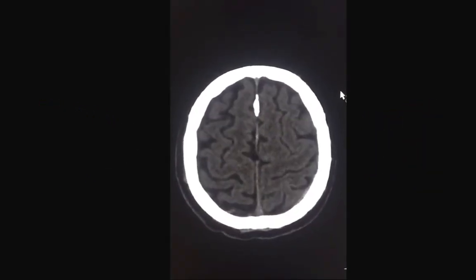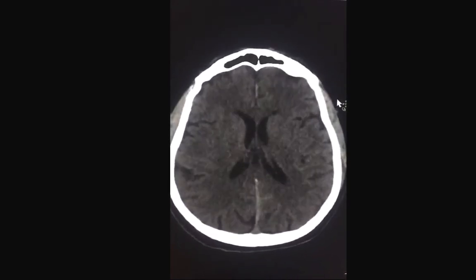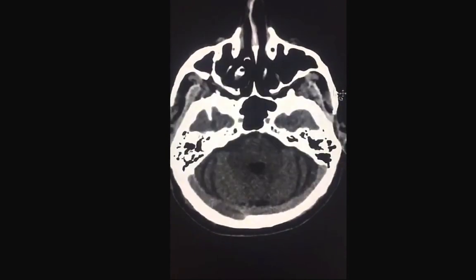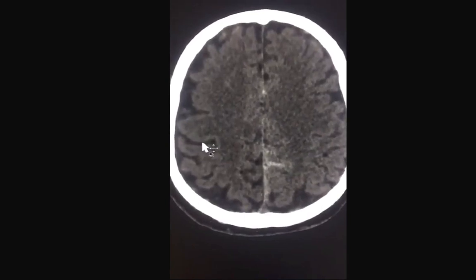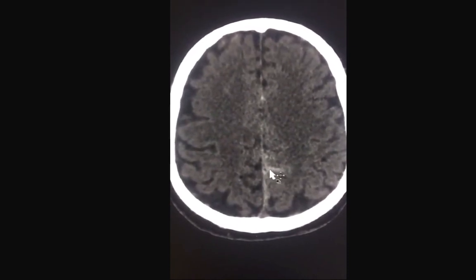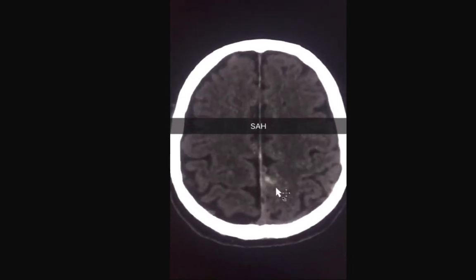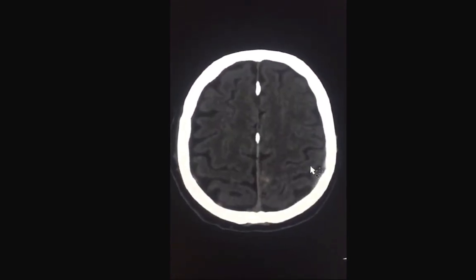This is a good practical case. A 68-year-old male patient who was involved in trauma. We already know that CSF in sulci should appear very dark, and this is not the case in this region. So these bright lines filling the sulci are consistent with bleeding, and since this is within the subarachnoid space, this is subarachnoid hemorrhage. Now take a look at this again.